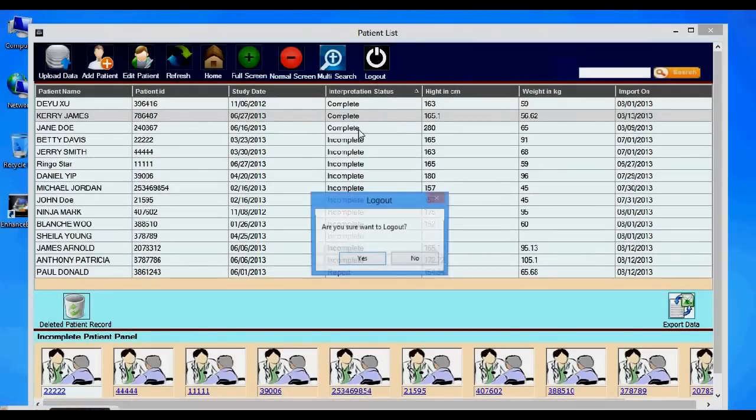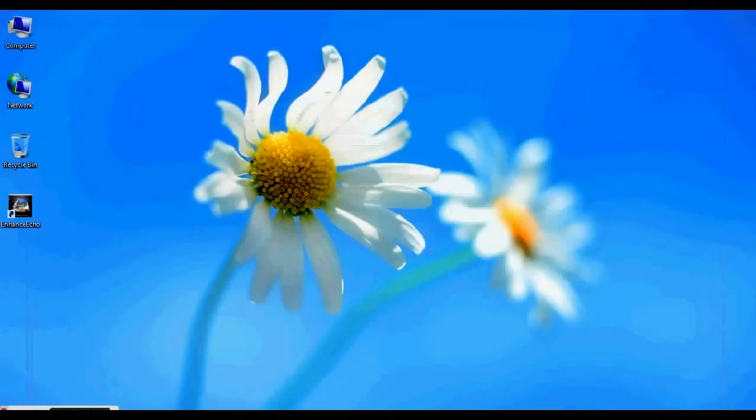Welcome to SciMetaSoft Enhance Echo training. Enhance Echo is a structured reporting software application.